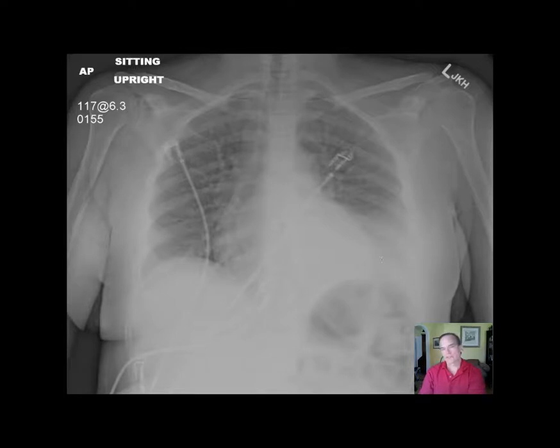And there is preservation of the left cardiac border. So this is indicating that it is a left lower lobe process, and the preservation of the cardiac border there suggests it is not involving the lingula. So this suggests it's probably a left lower lobe process, and given the clinical history, it's probably a left lower lobe pneumonia. The right lung is clear, period.